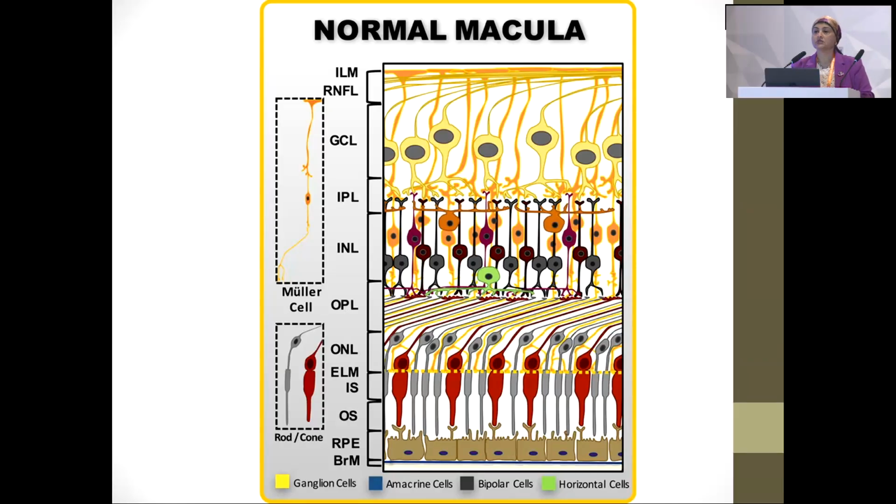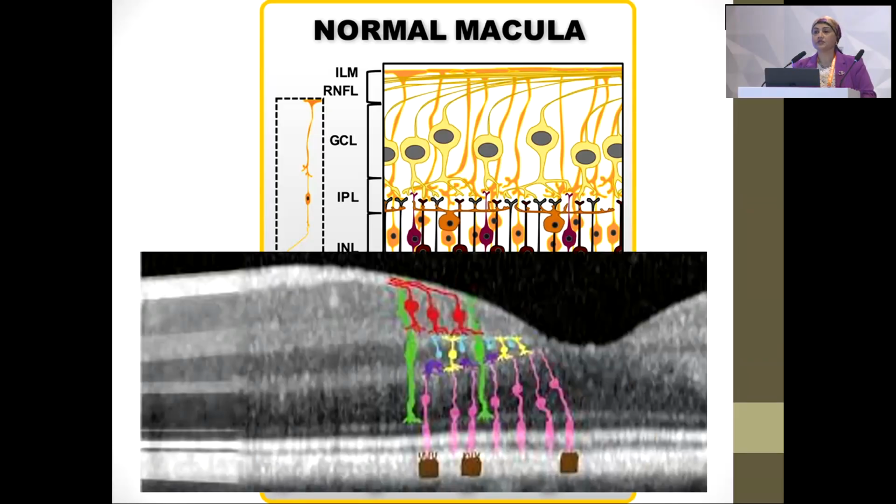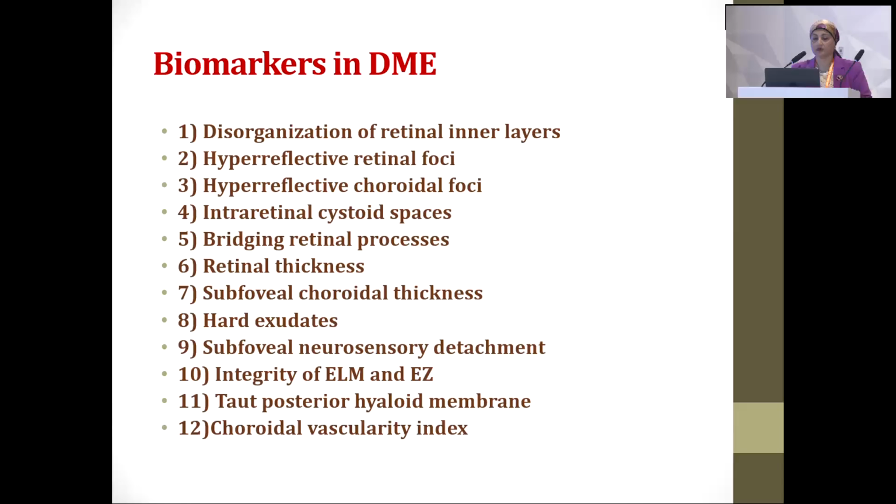This is, as we all know, the histology of the macular area, and we overlap this histology on the morphology and the reflectivity of the tissues in the OCT, which gives the integrity of the system, the 10 layers of the retina, starting from the nerve fiber layer, the interdigitations and the Muller cell fibers, the outer retinal layer, and the reflectivity of the outer retinal layer, which corresponds to the components of the nuclei of the photoreceptor layer, and up to the RPE layer, which is very, very important, as we all know, for intactness and the light stimulation and the light response.